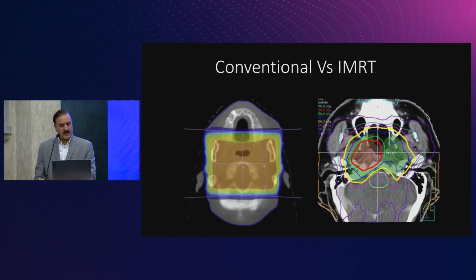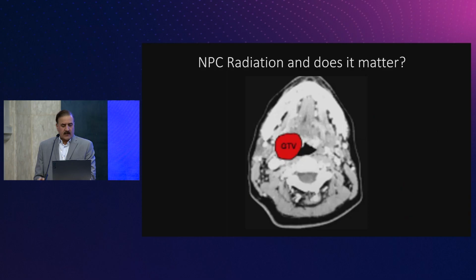This is the radiation treatment map where they go with the gross tumor volume, the clinical tumor volume, and all that. So this was a very, very interesting study that was done from University of Wisconsin. This was a nasopharyngeal cancer that was mapped by the radiation oncologist there. And then this image was sent to many radiation oncologists, both in private practice as well as in academia.